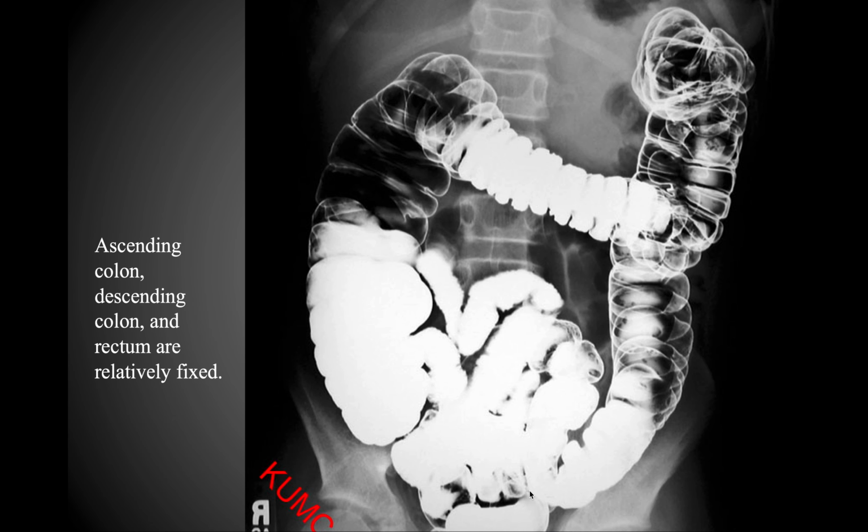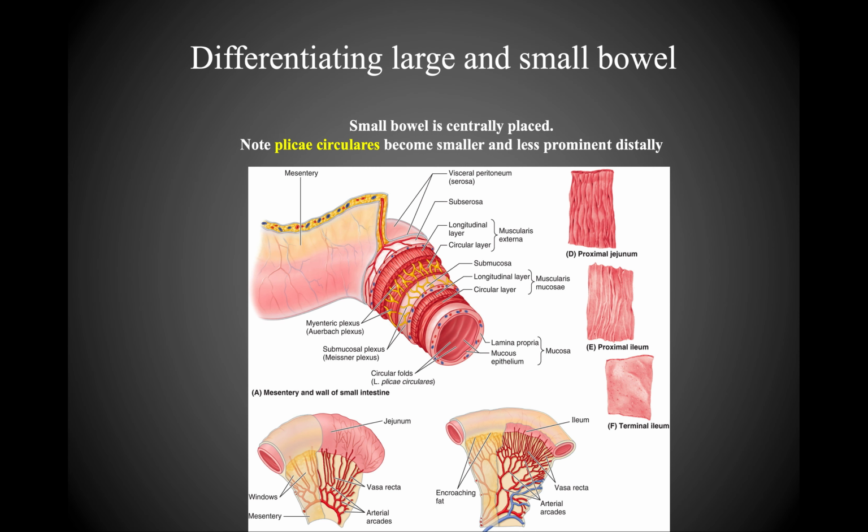So this is a nice barium study where you can really appreciate the colon. I mean, you can see the distal ileum, especially right here. You can see where the ileocecal junction is. So this is going to represent the cecum. You can see the ascending colon, hepatic flexure, the transverse colon, the splenic flexure, descending down here into the descending colon, and then eventually we're making our way through the sigmoid colon and then the rectum down here. And so again, these are all relatively fixed in place.